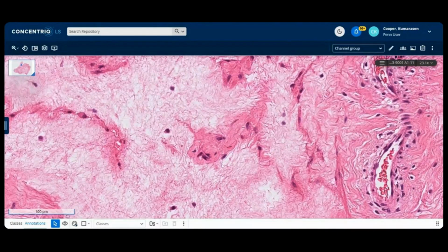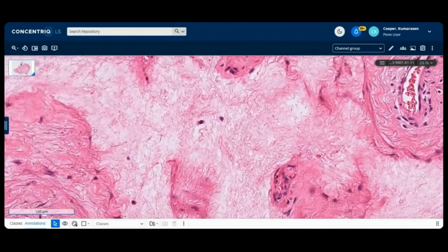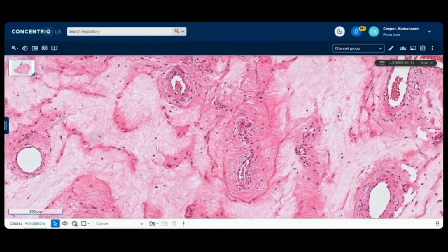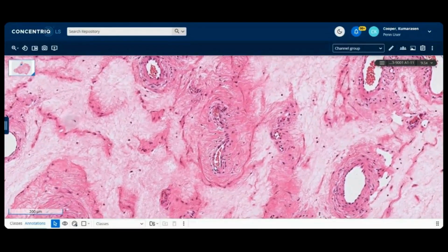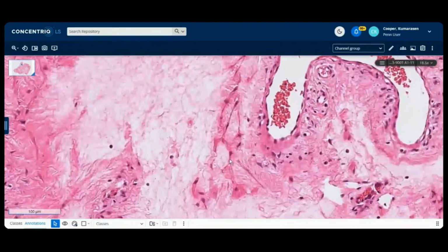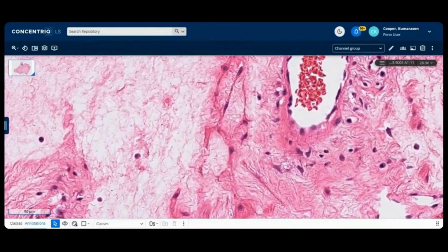And you can see how this is splayed by the water, the edema, all right? And that's what gives it that sort of almost myxoid appearance. And then the vessels, not to be left out, are important in that there's quite a few of them. So it's innumerable vessels, and you can see some of these cells here, cords and strands, bland looking, no mitoses.